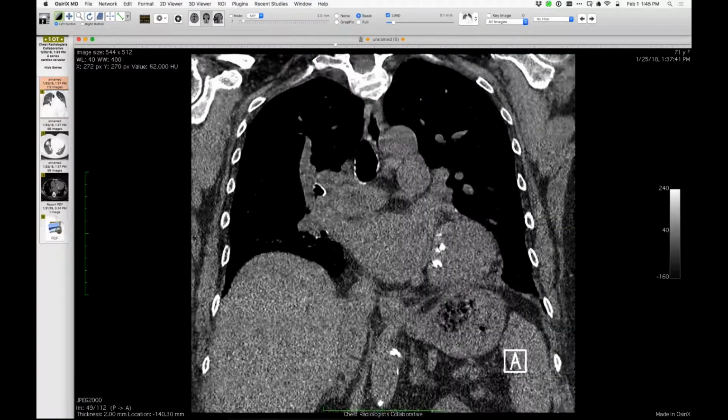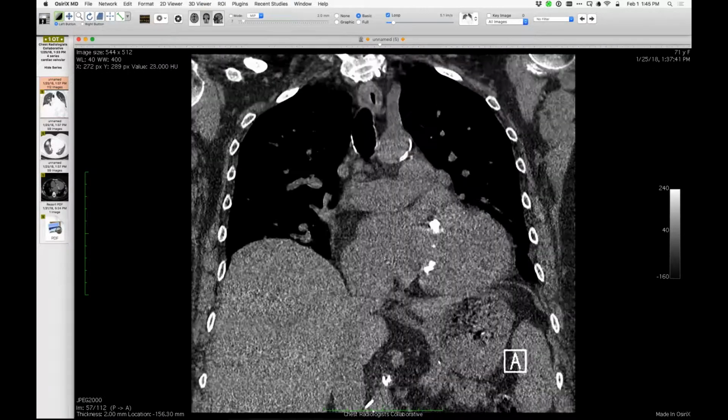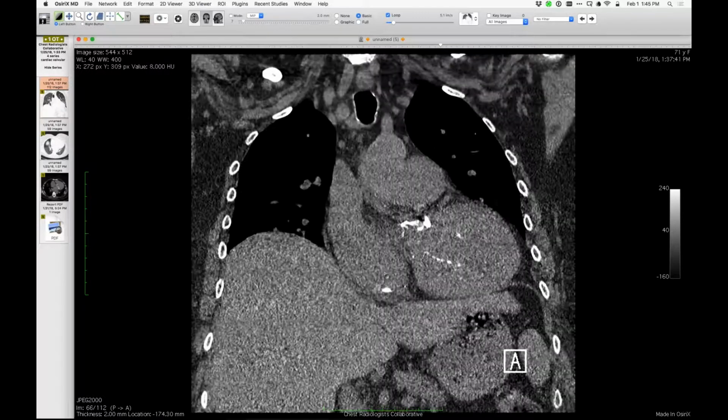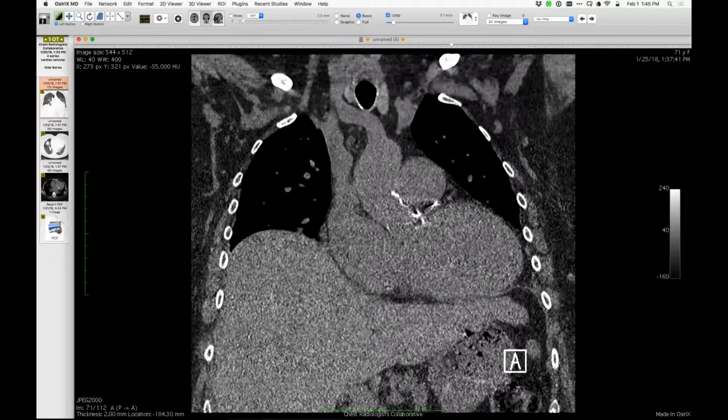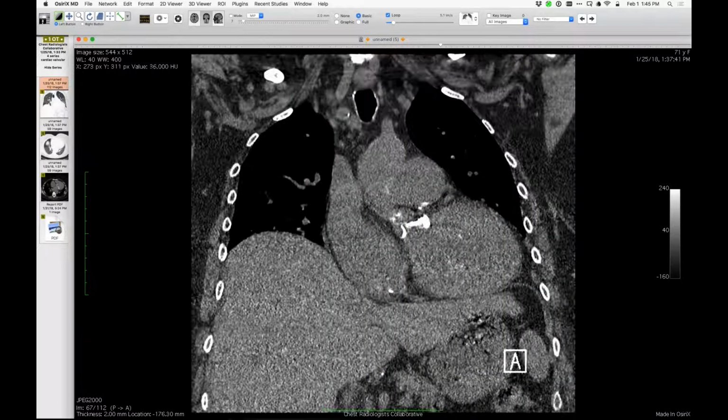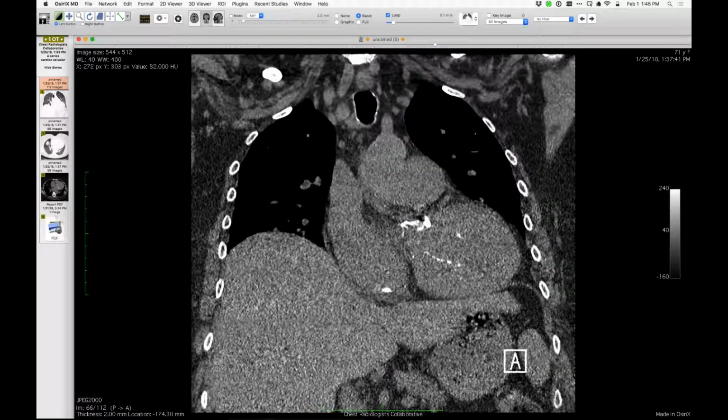Back up a little bit. This way, David. Keep going. Right there. So that one that just disappeared, it went by too fast. There. You see that string? Isn't that chordae shaped right there? Yeah, the little intermittent line.